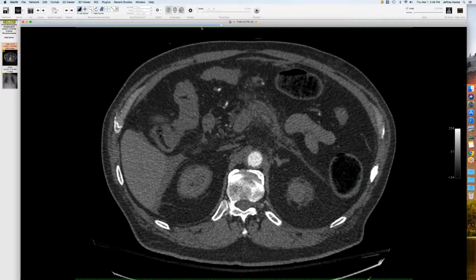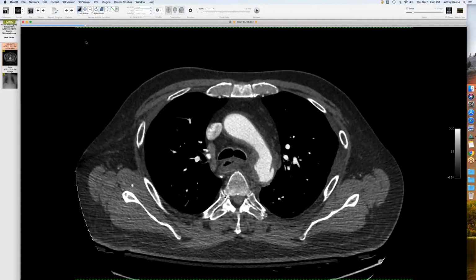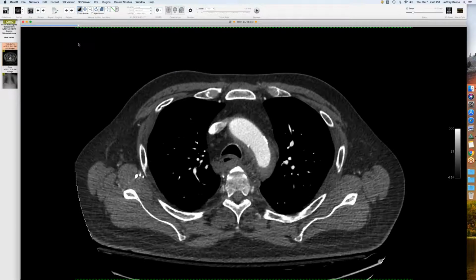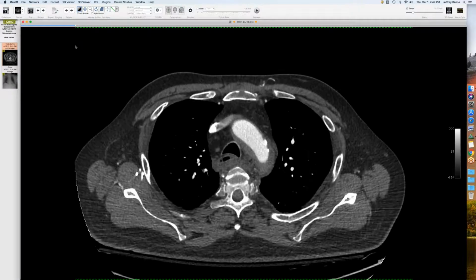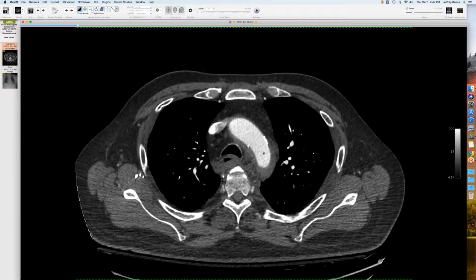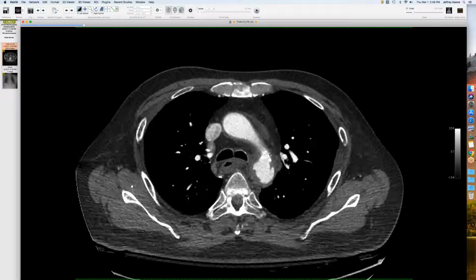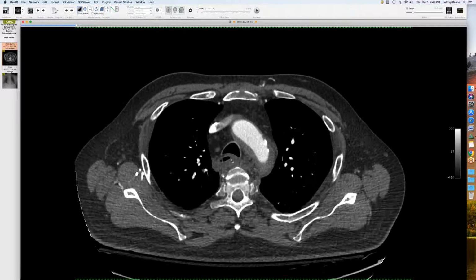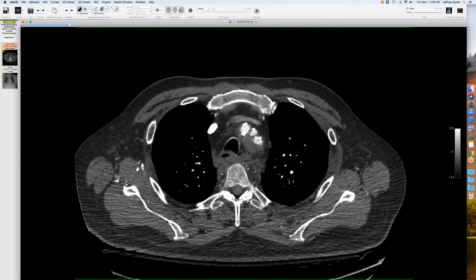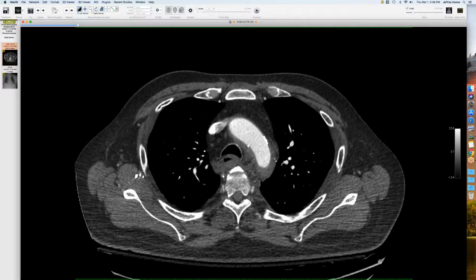So there is that classification system from the Society of Vascular Surgery that was based on a paper published from Harborview, I think back in 2012. And we've talked about the minimal aortic injury. So they talk about an intimal tear, and then there's a large intimal flap if it's more than 10 millimeters, or if there's a thrombus. This would qualify as a pseudoaneurysm. And I think all the mediastinal hematoma is part of it. He did have some spine fracture right here. So I think that's all related. And I think this is all contained.